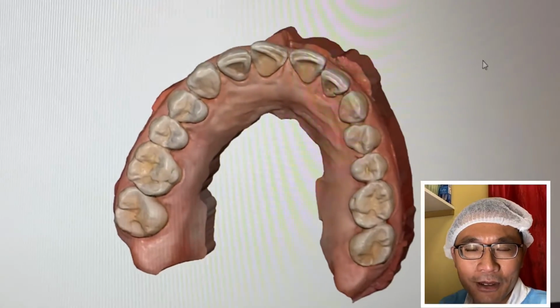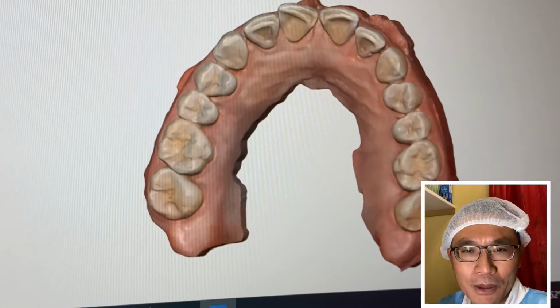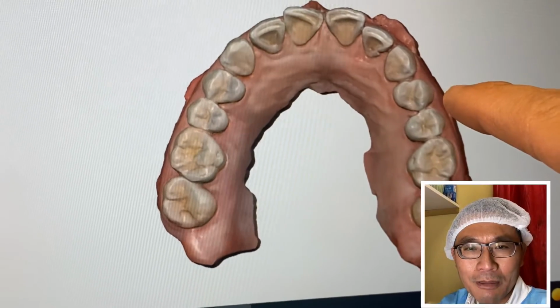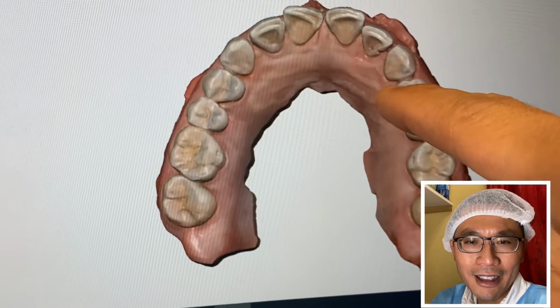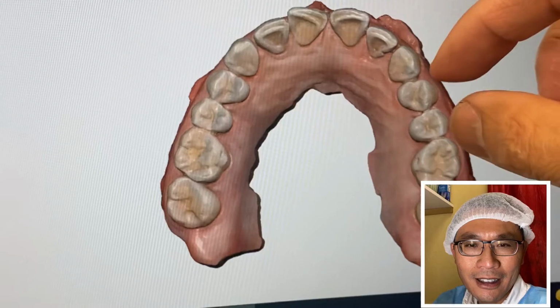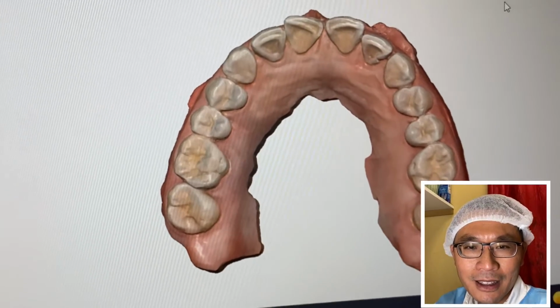One of the problems that you can see on this patient is that there's a couple of premolar rotations. The patient has a rotation right here on number 12, distally on the buccal cusp and mesially on the lingual cusp, as you can see. So when we move this over here, you can create some room and pull the teeth back and correct her bite problem, the overjet and overbite.